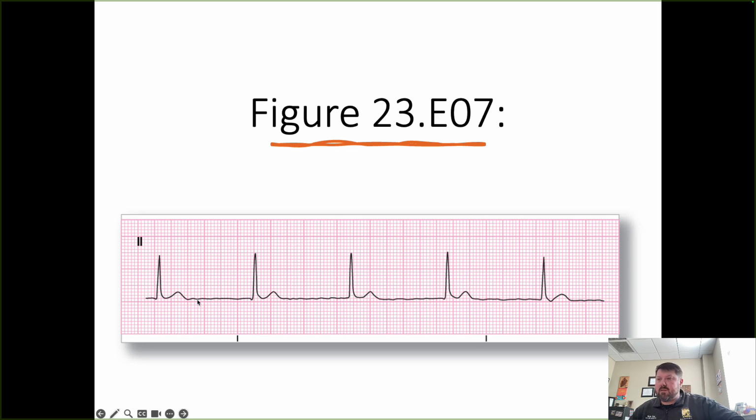Looking at this, don't get this confused with a fibrillating baseline of atrial fibrillation, because if I check my regularity, it is regular, and it's not irregularly irregular. My rate is 50. It's regular. I don't have a P wave present. My PRI is absent. And then my QRS, measuring from about right here to about right there, is about 0.06. So again, following the rules, the parameters of the rhythm, this is a junctional rhythm or junctional escape rhythm.